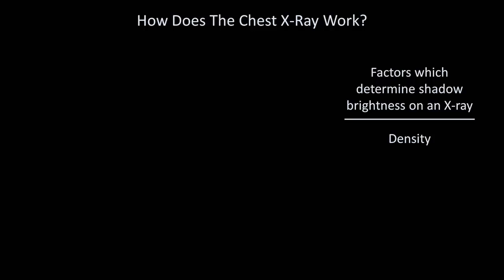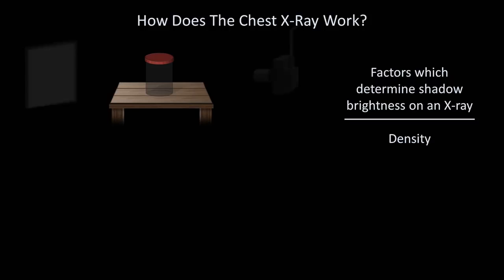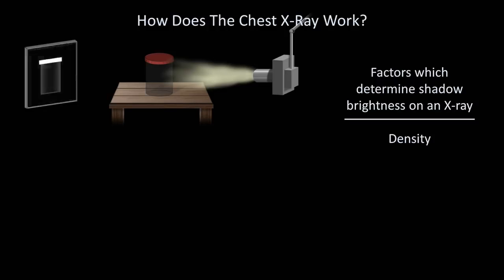Let me show you some examples. So here is our table, and on it I'll place an empty glass jar. The jar is filled just with some air. On the far side of the jar is our photographic film. Notice that it starts off white. The X-ray source is then brought in. We fire some X-rays at the jar, which of course aren't in the visible spectrum like this might suggest. As the X-rays are traveling across the table, the ones that either pass around the jar or through the jar interact with the film. Here's what's left.